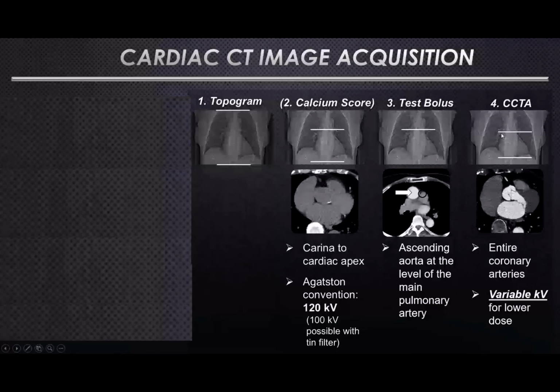The coronary CTA is then a bit more narrow as compared to the calcium score, because now you exactly know where the coronaries start and where they end. At the lower range, it is from a diagnostic view less important to visualize everything, because this will be just the very distal coronary artery parts.